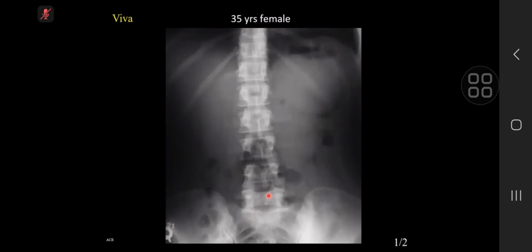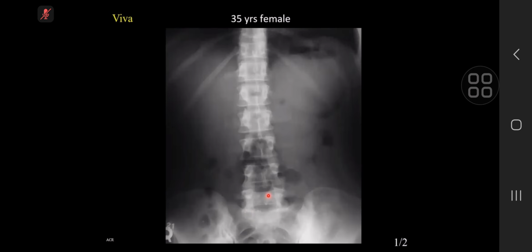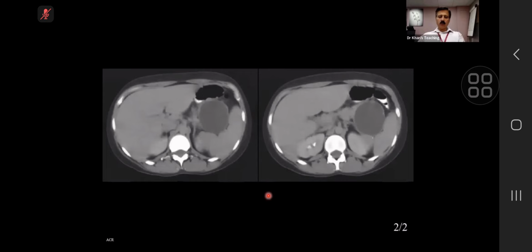Pancreatic lesion. Excellent. And what kind of pancreatic lesion comes to your mind? As big as that. So a pseudocyst. Brilliant. Well done. So this was a pseudocyst. So well done, candidate 3. We will go to candidate 4.